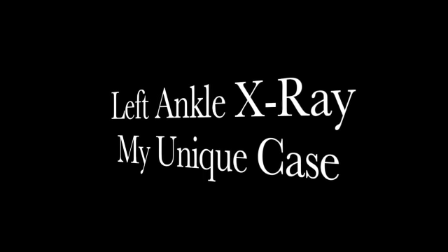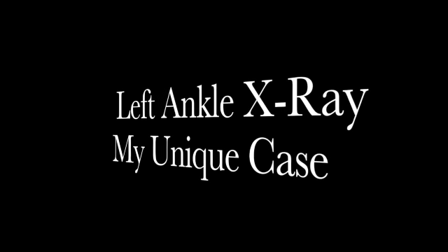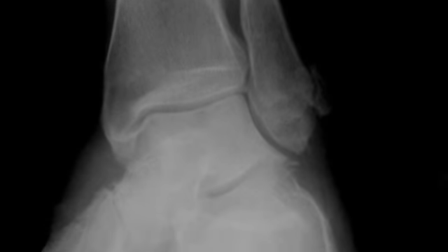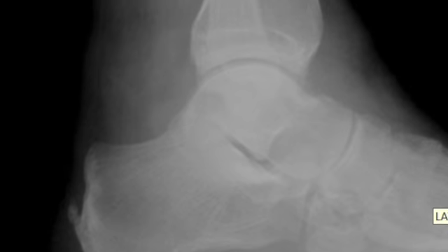Hello everyone, my name is Tshering Bhutia and I'm going to present my unique case on trauma ankle with three views: AP, oblique and lateral. Before I show my radiograph, let me introduce my patient.